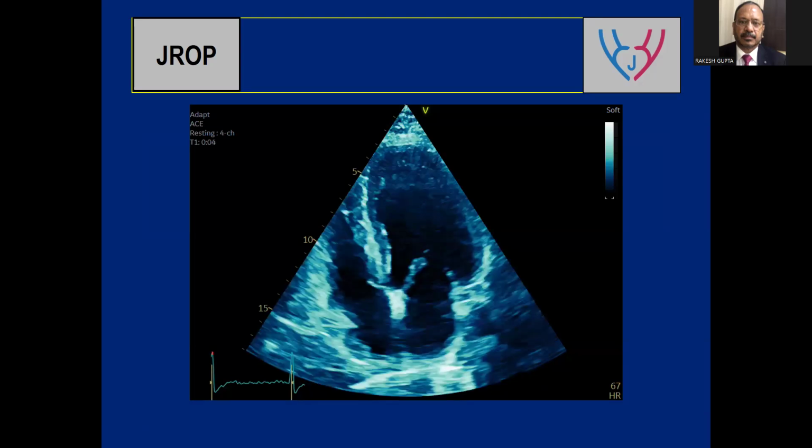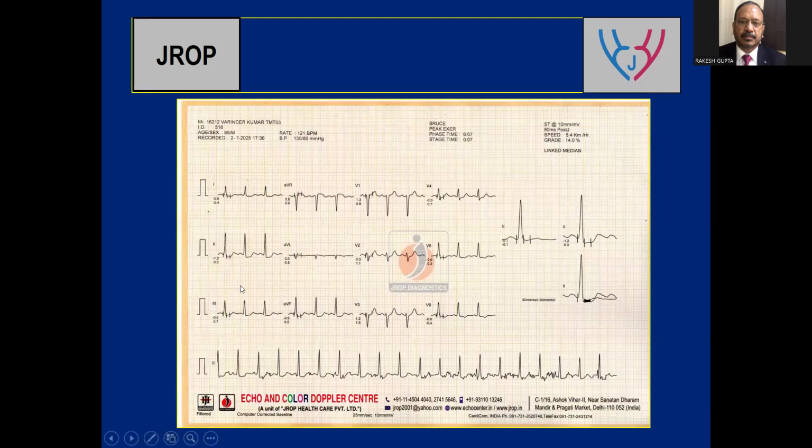And if you go back to that ECG, it classically shows ST segment depression in leads 2, 3, aVF, and it is showing at V5, V6. Now there is a poor progression of R wave, but the diagnosis lies somewhere over here in circumflex territory.